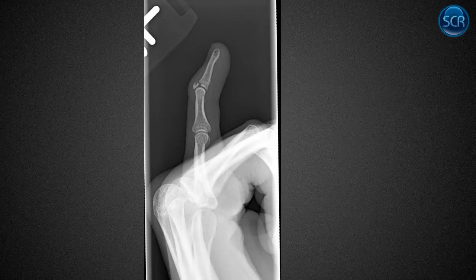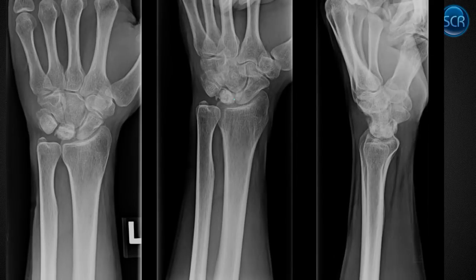This is a mallet finger. So if you fracture off the posterior aspect of the base of a distal phalanx, that's actually where your extensor tendon inserts. And so if you fracture that thing off, it's going to pull that off. And that's a mallet finger, and it causes this little flexion deformity because you can't extend your finger because your attachment isn't there. So kind of a persistent flexion of the DIP after trauma. That's a mallet finger, and then on X-ray we see this. So this needs to be braced in extension so that this heals up and is allowed to heal without excessive tension from the extensor tendon.